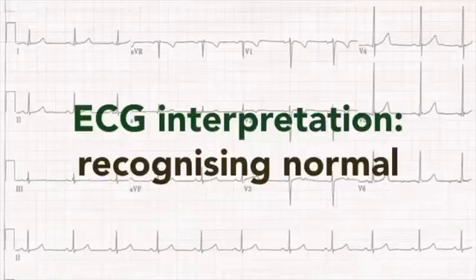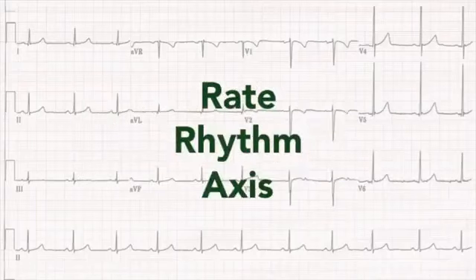ECGs are best interpreted using a structured approach, initially screening for deviations from a normal pattern. This short clip will cover a simple system of rate, rhythm, axis to help recognize the normal ECG.